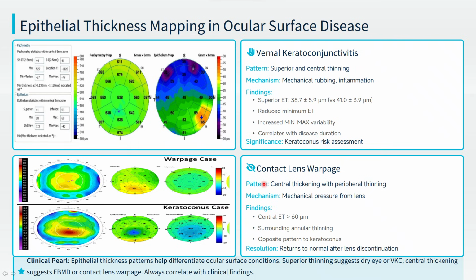The primary disease, keratoconus, is primarily affecting the stroma, and the stroma thins and bulges forward, creating a cone-shaped protrusion. Then the epithelium acts as a smoothing filter that thins over this apex.